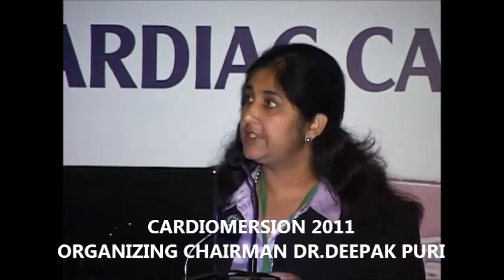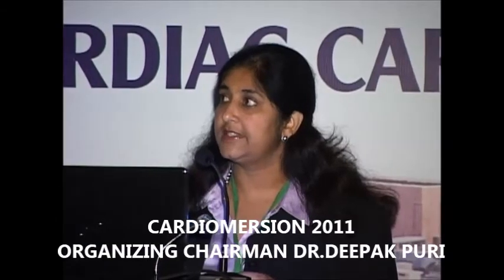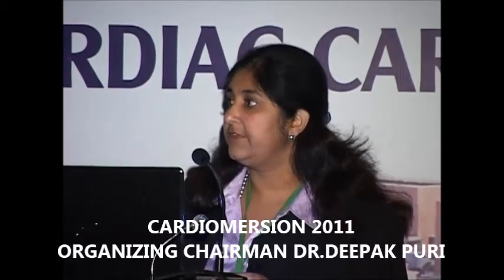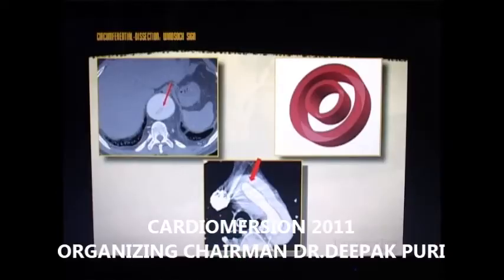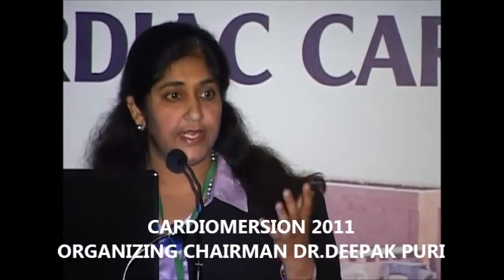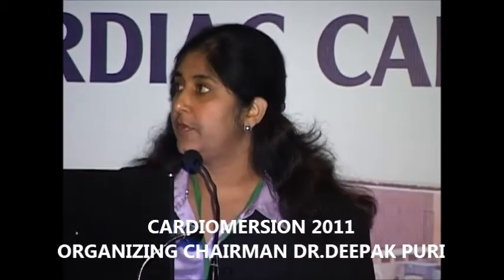And this is a special type of dissection where there is a 360-degree tear of the intima, which leads to a basically double barrel kind of aorta. As you can see, this is the true lumen, and this is surrounded by the false lumen. This is yet another example showing the circumferential tear of the intima and demonstrating the true lumen inside, which is the darker lumen, and the false lumen outside. There is a problem in this sort of dissection that it can lead to branch vessel obstruction, so it should be recognized and treated appropriately.